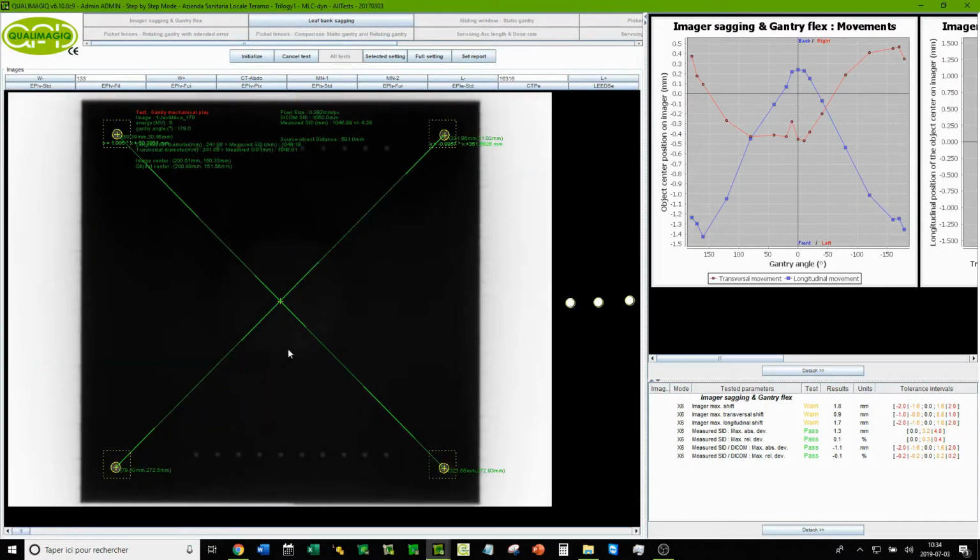This test is carried out with a static gantry angle. It may take a while, as 15 images were made, taking 15 minutes. Today, this test can be saved in QUALIMAGIQ for use in the next quality control without having to repeat the pretest. In other words, reusing the pretest performed for the preceding quality control to avoid having to repeat the pretest.